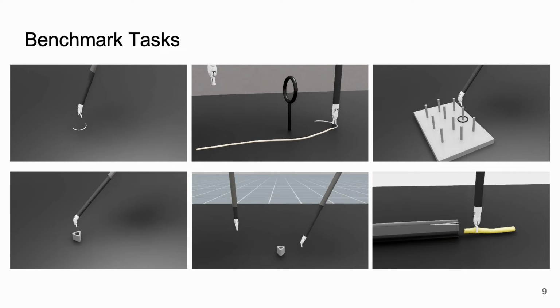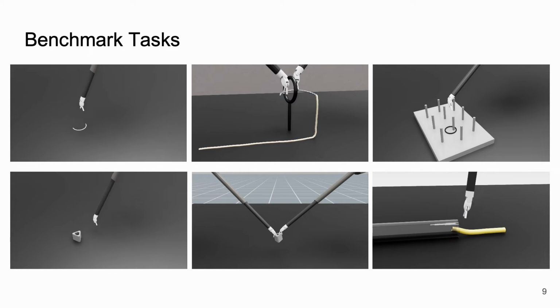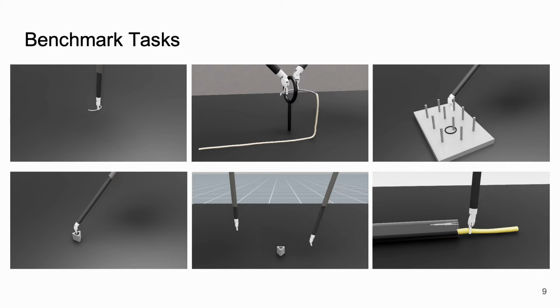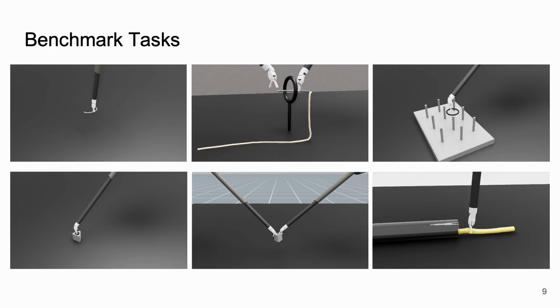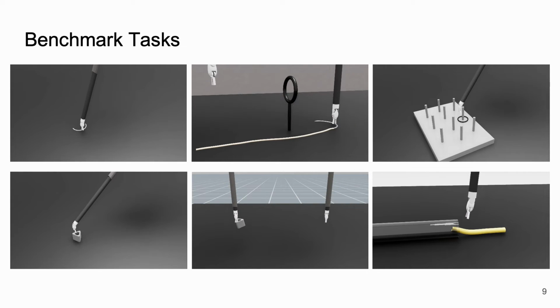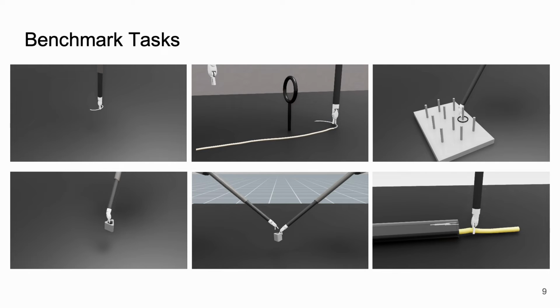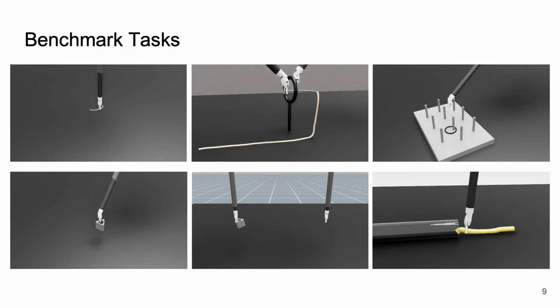Orbit Surgical provides task environments inspired by the fundamentals of laparoscopic surgery training curriculum to reflect the technical skills for basic surgical maneuvers. The tasks are categorized into single and dual arm environments to provide a spectrum of training complexities. Each task is provided in a standalone environment for benchmarking. These environments can be used for generating handcrafted trajectories, collecting human expert samples using multiple input peripherals, as well as training policies to facilitate advancements in surgical autonomy.